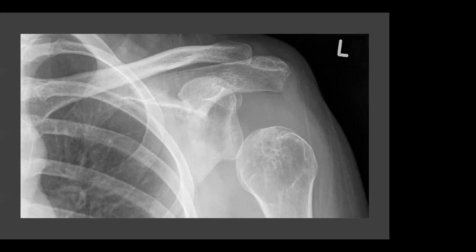So your humeral head and your glenoid fossa should be nicely aligned. And if they are, we describe the joint as being end-located. And this means that the bones are in the correct place. Here on this plain film, if you notice, the head of the humerus is inferiorly subluxed against the glenoid. And this is what we call subluxation. This means that there's a gap between the inferior cortex of the acromion and the humeral head.